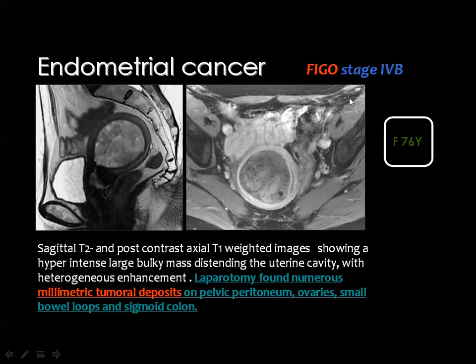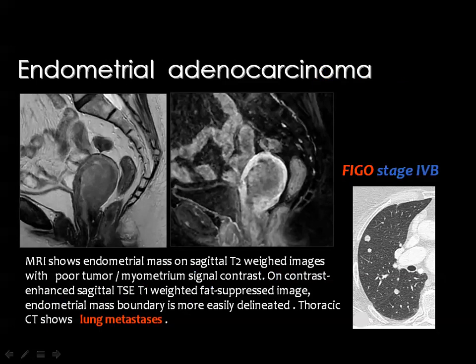And in this lesion, you can feel that the tumor is totally confined to the uterus, but at surgery there were peritoneal deposits, ovarian deposits, and deposits within the intestine as well, and this is considered stage 4B.